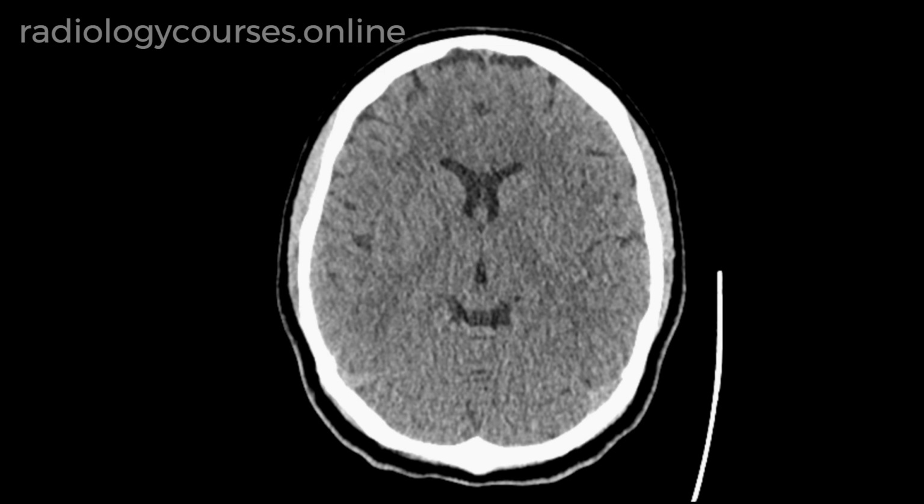what is the diagnosis? The common CSF attenuation areas found in the midline between the lateral ventricles are few. The most common one is persistent cavum septum pellucidum. The common differential diagnosis for persistent cavum septum pellucidum is cavum vergae. So what is the difference between cavum septum pellucidum and cavum vergae? Cavum septum pellucidum is situated anterior to the anterior columns of the fornix, whereas cavum vergae is situated posterior to the anterior columns of the fornix.